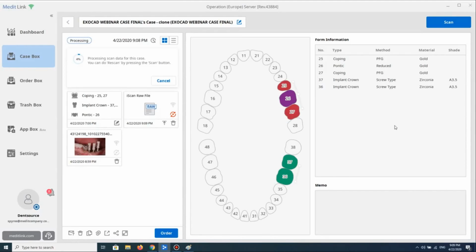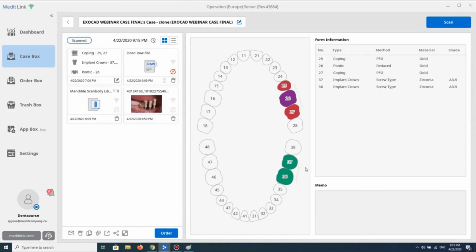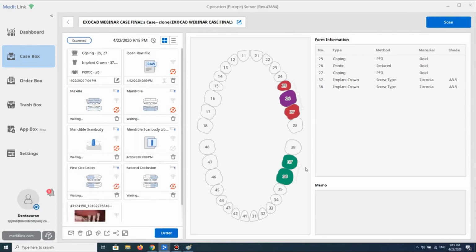And of course, the parameter that we always consider that is already preset is that you use a laptop or a desktop that has the specifications that we recommend also on our help center. So here the post-processing is finished, as you see. Now if you would like, you can export instantly and locally in your desktop the whole case, but I'm not going to do that here.